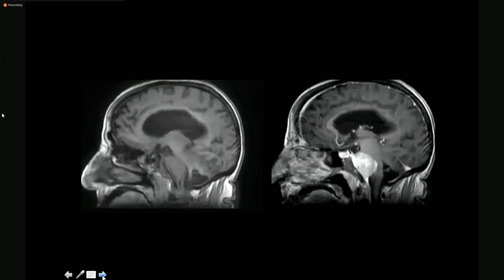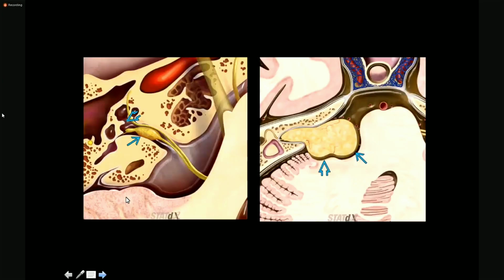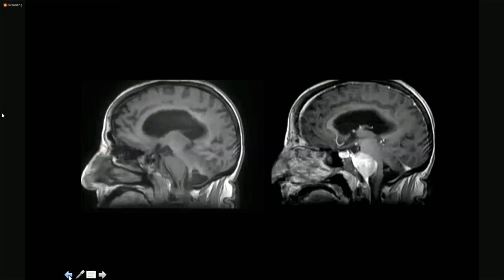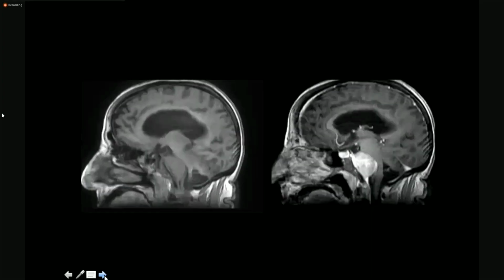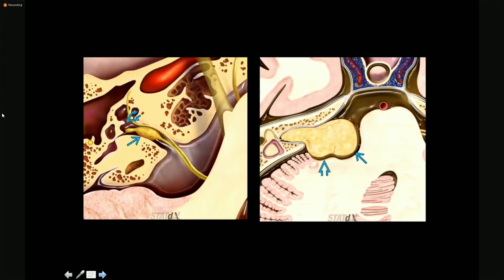Meningioma. Right, absolutely correct. So it's a vestibular schwannoma, and then meningioma comes in the differential if you don't see its extension. This was basically a case referred to us for CyberKnife. And the patient had 2 scans over a span of 3 months. Initially, it was labeled as schwannoma from one center. Later on, from another bigger center, it was labeled as a meningioma. So our oncologist was really confused at which one is this. For that case, you have to look at its extension into the internal auditory meatus, and that is actually the problem-solving statement. So you have to look that there is extension.